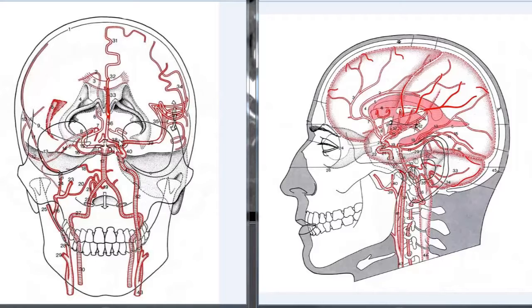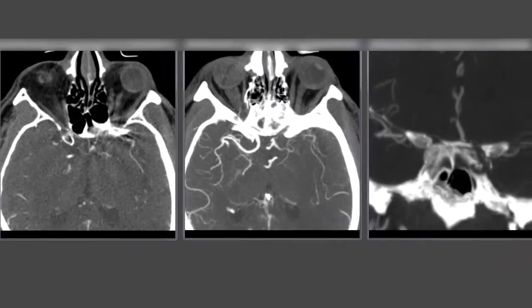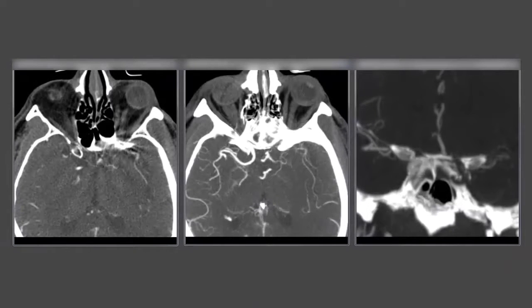If there's a clot that covers all of those potential channels here, a large carotid terminus clot, there's really nowhere for the blood to go in the internal carotid artery, so you're not going to have very much filling in the neck. But it's going to have most often a typical appearance that we'll see on this patient's CT angiogram that distinguishes it from an atherosclerotic occlusion of the internal carotid artery right here at its origin. So we'll bring up our CT angiogram portion down in the neck reconstructions and get a view of what's going on in our patient's situation here.